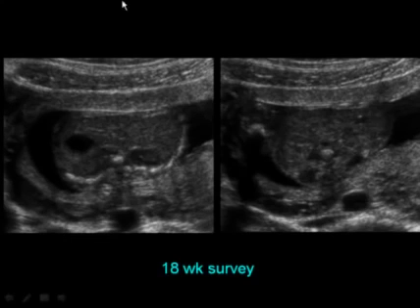So here's an example of a patient shown to you at 18 weeks. This is reported as kidneys, but we're at the level of the stomach, and here's the hypoechoic area on the left, hypoechoic area on the right. These are the adrenal glands. And this image, taken much lower down with no stomach on the image, is the kidneys. Here's a kidney here and a kidney here. And indeed, they're very subtle. They're hard to see at 18 weeks.